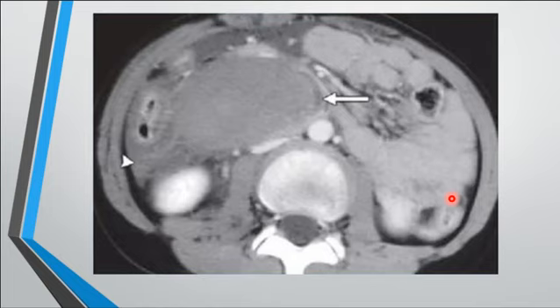It is not so clear. Yes, I agree. Well, there is a history of trauma to help you. And this is the duodenum here. So there is a duodenal hematoma. Okay? There is marked focal duodenal wall thickening. You can see this is just the patent lumen, and all of it is a big lesion that is a hematoma. And this case had a history of trauma, whatever the type of trauma. And you can see there is some free fluid here.